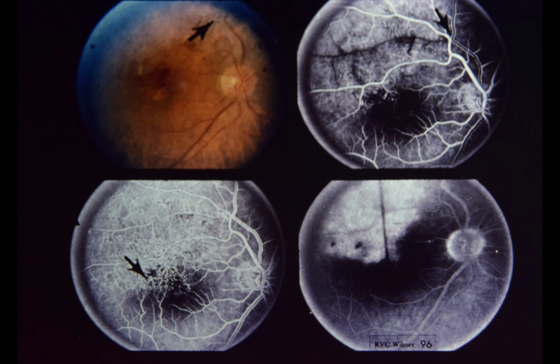Slide 96, quiz slide number 2. This 54-year-old white male noted sudden loss of vision in the right eye. Visual acuity was 20/40. Here are your questions. 1. What is the diagnosis? 2. With what systemic and ocular conditions is this disorder associated? 3. Describe the angiographic findings. 4. Is there any treatment documented to be of benefit for this condition?